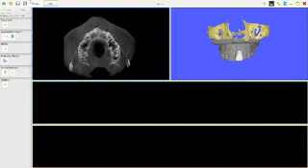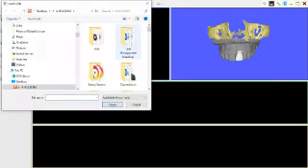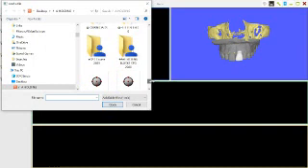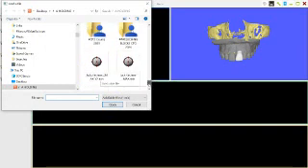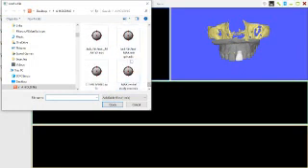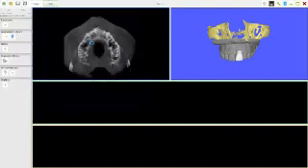You will get this file by going to the yellow tag, navigating down, and I've got a folder for you, which will be sent via WeTransfer, called Maxillary Central Study Case Axis. This one here, this is what you're going to get.